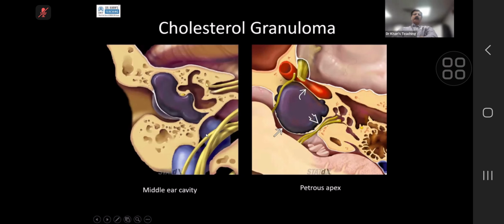It is very chronic, and I have read a study in the literature way back where they documented a cholesterol granuloma developing over 22 years, because they had serial imaging. What happens is that it keeps bleeding within the lesion, so part of the high signal is hemorrhage. Part of it is cholesterol crystals. That is the concept, and it will cause expansion. The radiology is Aunt Minnie radiology.